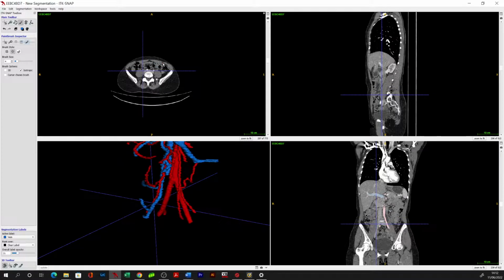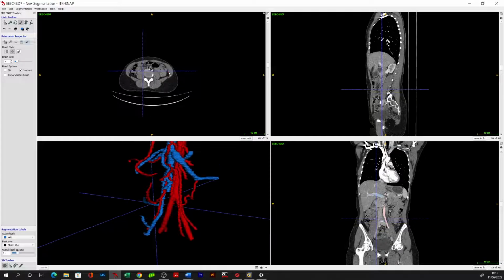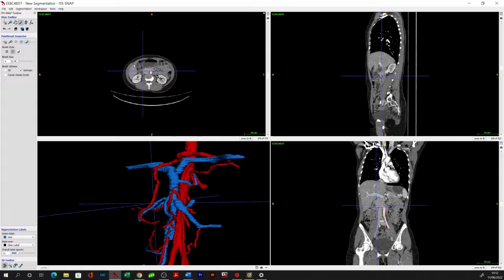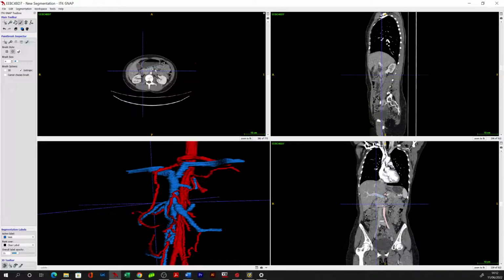coming out here at the front, you know that this is going to be the transverse colon. However, if you're getting into this territory around the splenic flexure and around the hepatic flexure, it can be somewhat difficult to differentiate what is ascending versus hepatic versus transverse colon. So in that situation, there's a degree of interpretation and that would then dictate what the vessel is called.